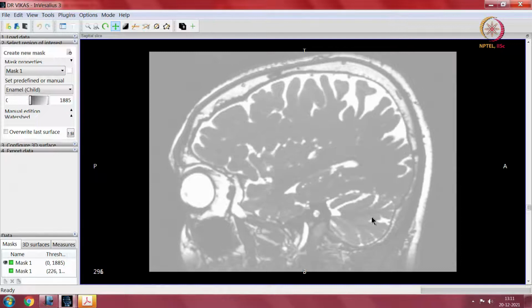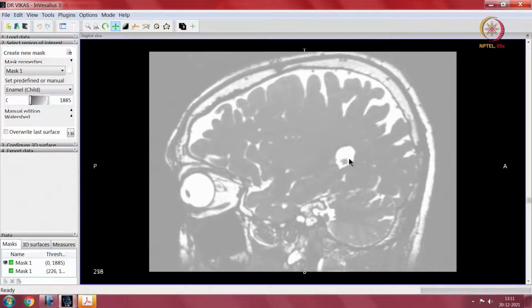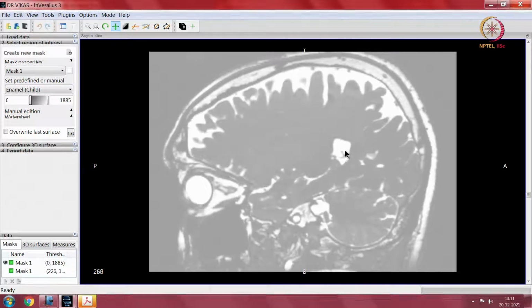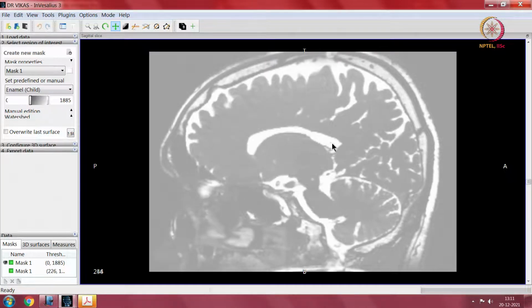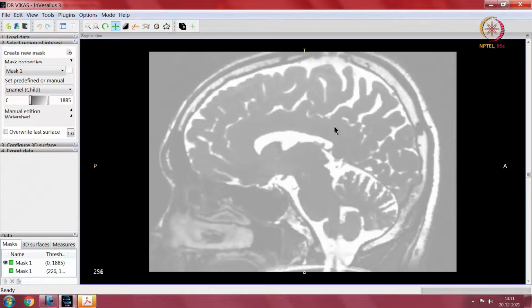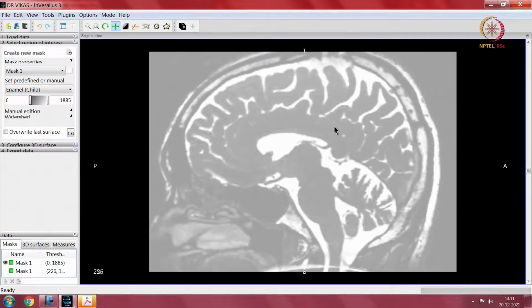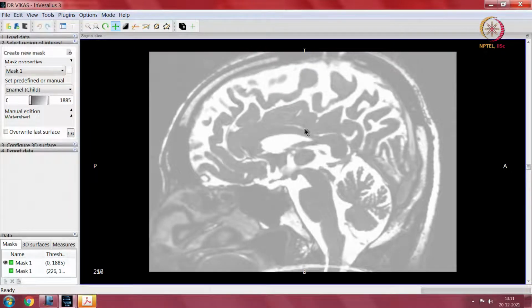Okay, so the hippocampus is again seen over here as the temporal horn, tracing it up. This forms the lateral ventricle. So, that is the full lateral ventricle. This bulge which is seen is the caudate head again. You can't make out the caudate head from the rest of the stuff because of the sequence which is used. But I did not come to the midline for that purpose. I came to the midline for this.